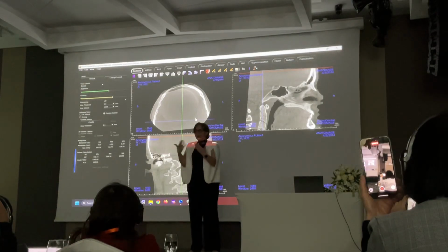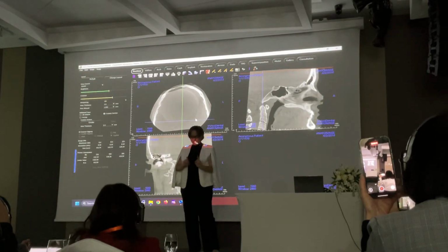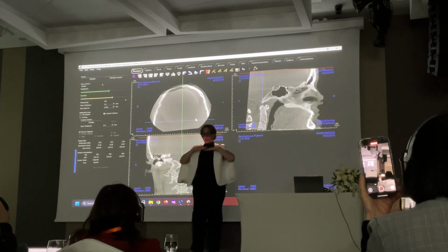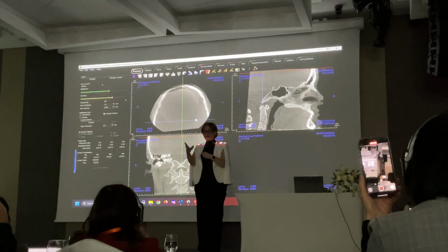Before you learn your anatomy, this is a concept that you need to think about. Bone has to be surrounded by dense cortical bone, and the inside needs to be of the same density, okay? No variations in density. You're going to go through that, and then of course we get into the skull base, which is more complicated. I'll show you how to do it, but this is something that's going to require you learning more about your anatomy.